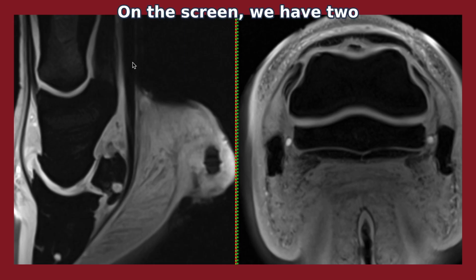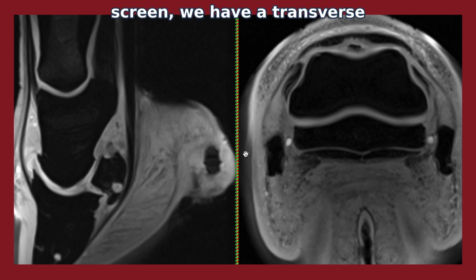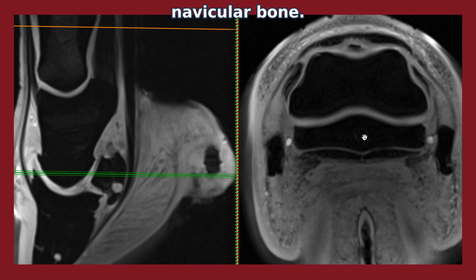Okay, on the screen we have two MRI sequences. On the left of the screen, we have a sagittal sequence. Just to orient you, we have the proximal phalanx, the middle phalanx, and the distal phalanx. This is the navicular bone here. And on the right of the screen, we have a transverse image, through at the level of the green line. We can see the middle phalanx, the navicular bone, and then you can just see the palmar processes of the distal phalanx creeping in.